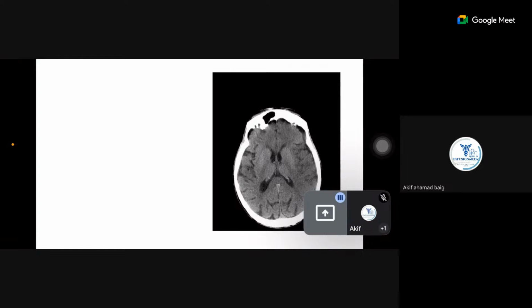As general medicine residents, you tend to see more of stroke patients, pneumonia patients, and renal failure patients. Stroke presents with these two signs mainly: the dense MCA sign in acute ischemic stroke, and the loss of insular ribbon sign.